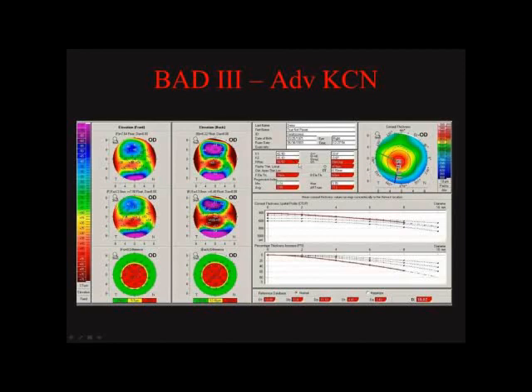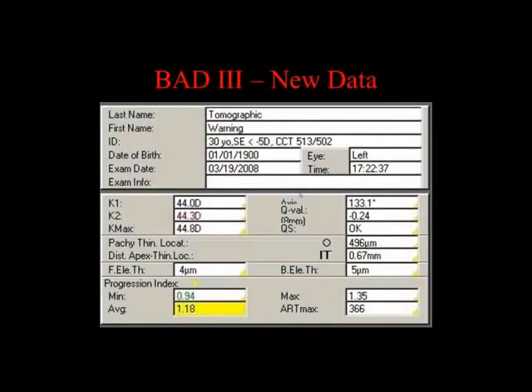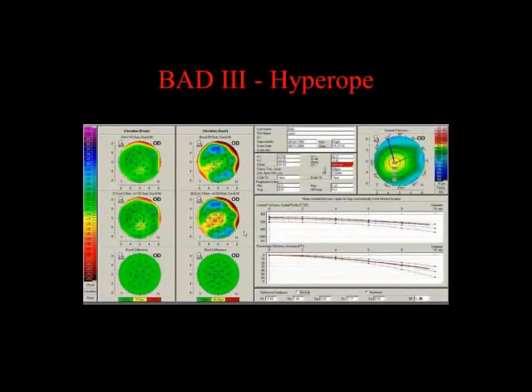You will also notice that everywhere you look on the map, and it may be a little hard to see on this one, are these little yellow triangles. And I think I'll show you a close-up in a second, right there. These yellow triangles. If you were to put your cursor over the triangle and right-click, I think it's a right-click, it opens up a drop-down menu that will explain what those parameters are. And these are all over the map. So if you ever have a question, the first thing to do is just go to the map. Obviously, not the printout, got to be on the screen. Right-click on this, and it'll drop down and explain what those parameters are.